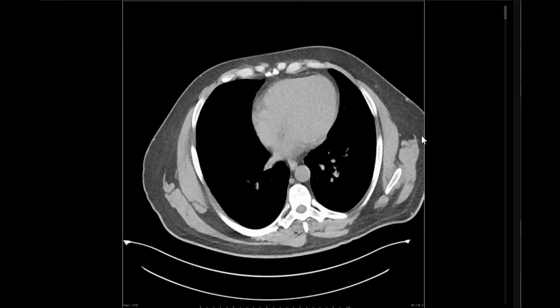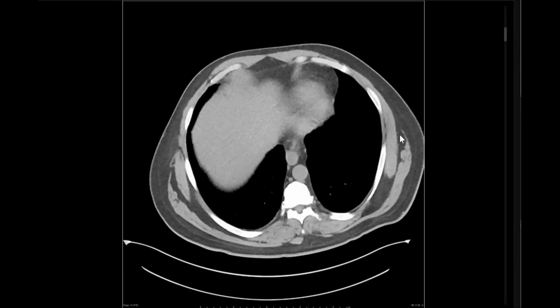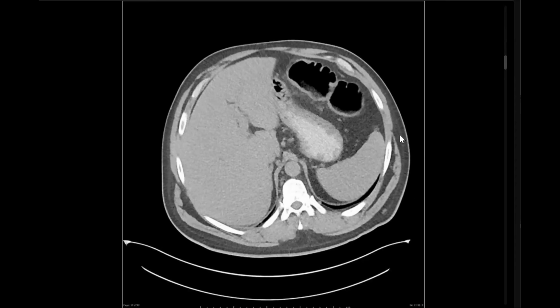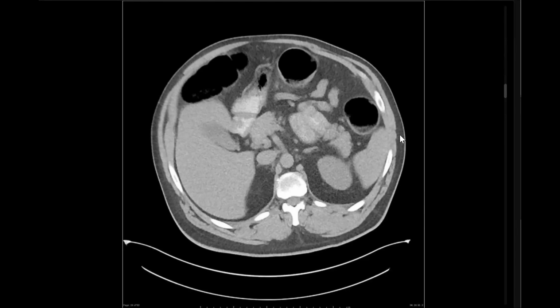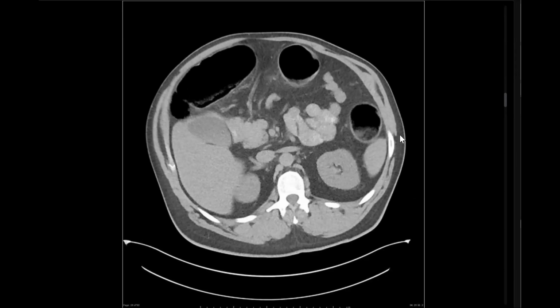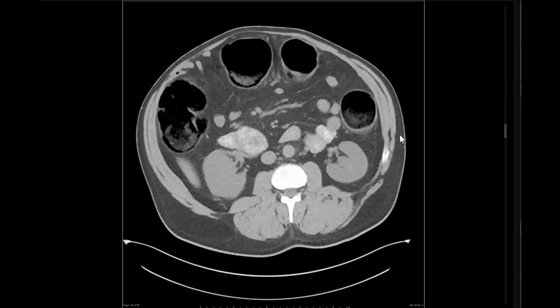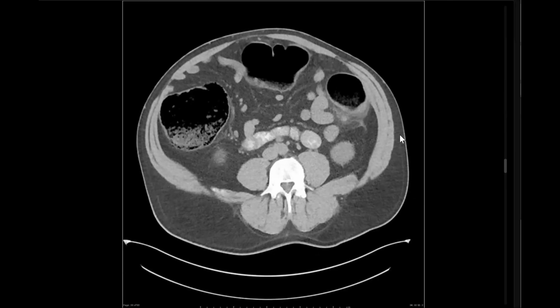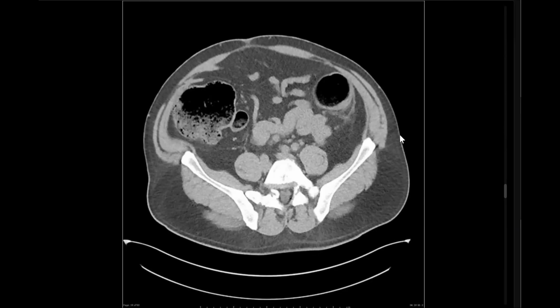I'm presented with an axial CT scan of the same patient. Are you sure it's portovenous? Oh, it's non-contrast. Yes, no IV contrast, just oral contrast is given. Good. Okay, so I'm scrolling from up down to check for the abnormality. I can see the dilated large bowel loops, ascending, descending colon, transverse. There is surrounding fat stranding on the left side.